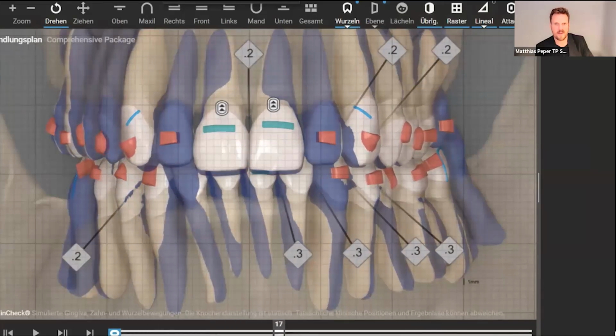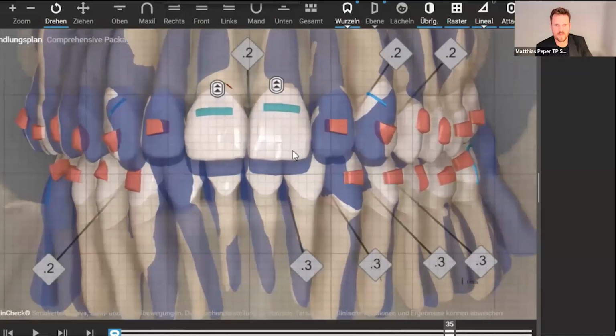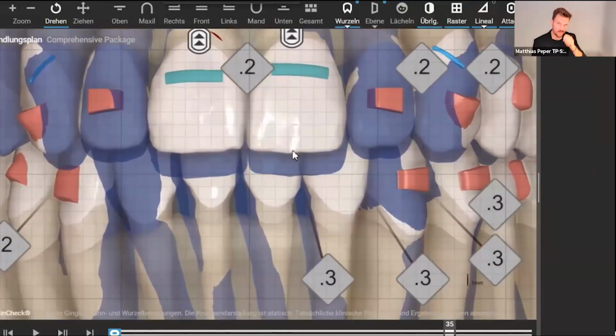And now I can see, wow, this is 1.8 millimeter of upper anterior intrusion. And the biggest question is, I can think about semi-sequential movements, frog staging intrusion, retroclined pattern. I can think about everything, but if the result of the treatment plan is wrong, I don't need to think about the sequences.